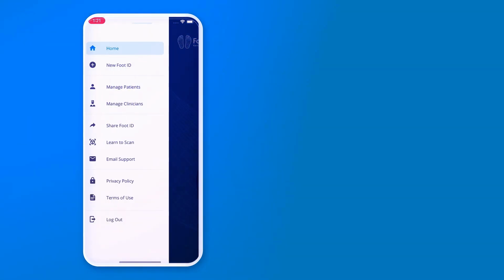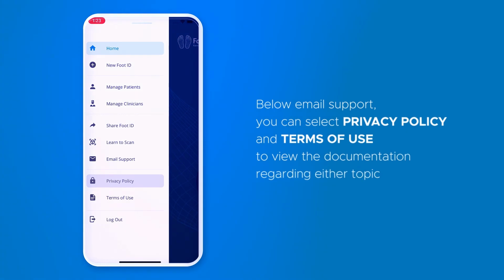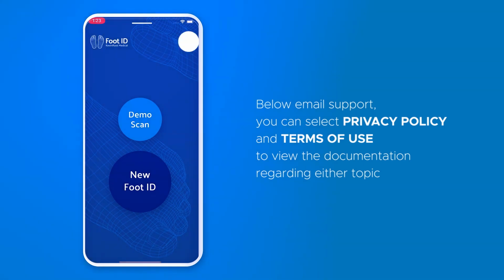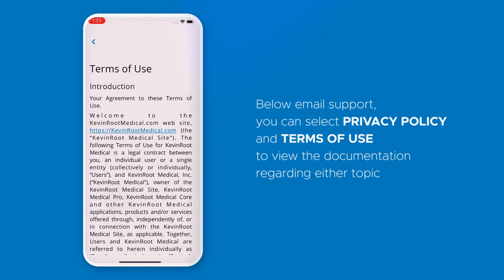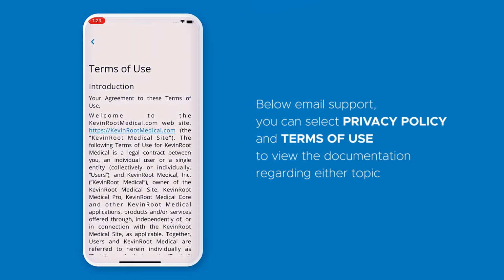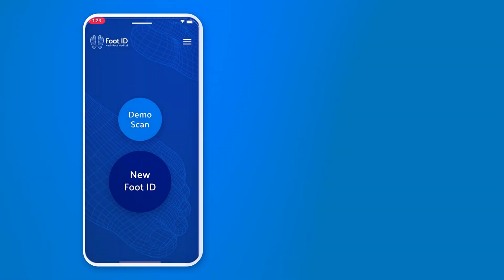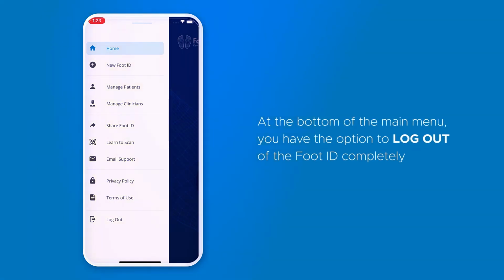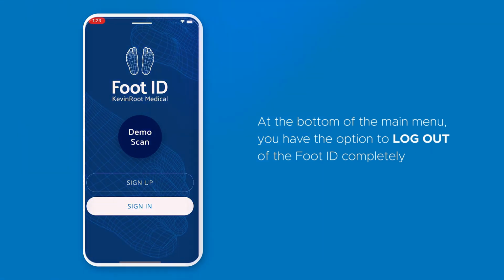And below email support, you can select privacy policy and terms of use to view the documentation regarding either topic. Finally, at the bottom of the main menu, you have the option to log out of Foot ID completely.